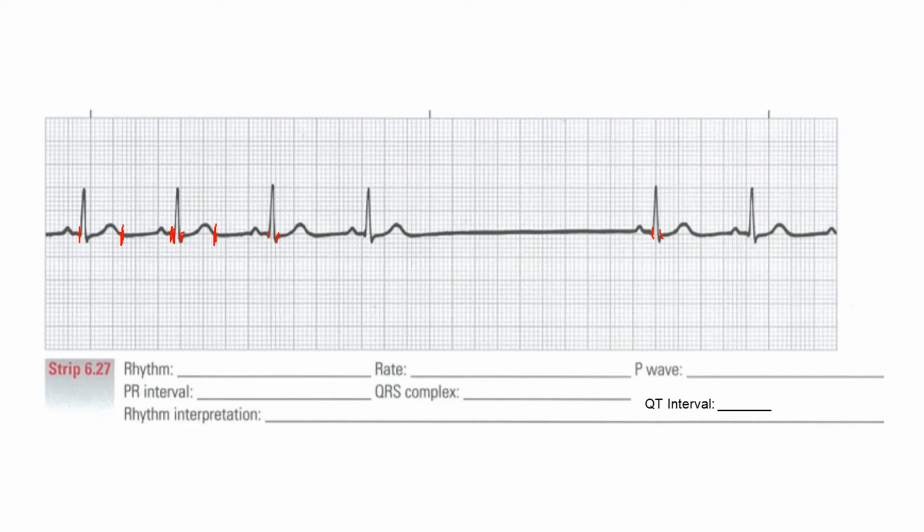So what kind of pause is it? Is it a sinus arrest or a sinus exit block? Now, if you did your calipers, I know I'm not going to do it right here, but if you did your calipers, and it did come in on time, these are not good calipers, it's almost like it's missing 2 complexes, and it would be considered a sinus exit block.